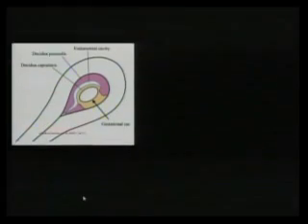A lot of gibberish, so a picture's worth 1,000 words, and this is what's happening. This is the gestational sac. Here's the endometrial cavity, again eccentrically located, and this is the capsularis here. This is the parietalis, which comes all the way around, and then the gestational sac forms. This is actually where your placenta will eventually form.